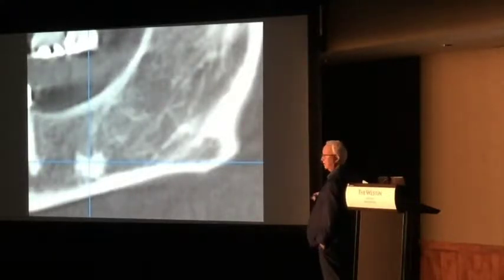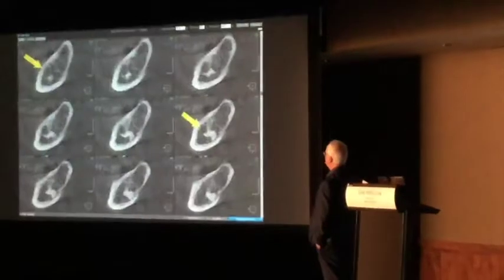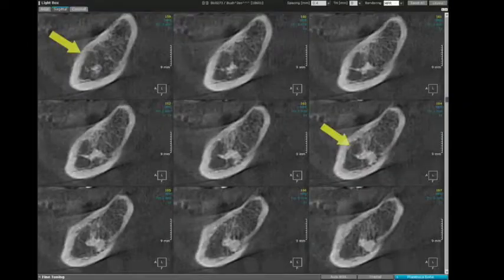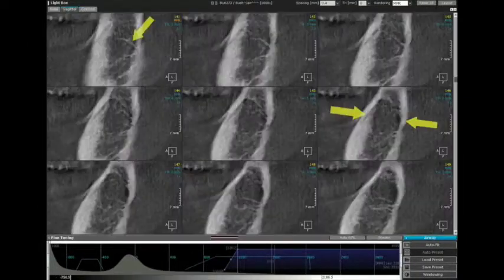There was no root canal done there, and certainly no tooth extraction. Maybe there was a third molar, but it wasn't in the last little while. But I thought maybe this is the area, so that's where I went and looked. And I did some, you know, multiplanar images looking at that area. I still can't tell you whether that's her problem. Then I go in, I change that area.